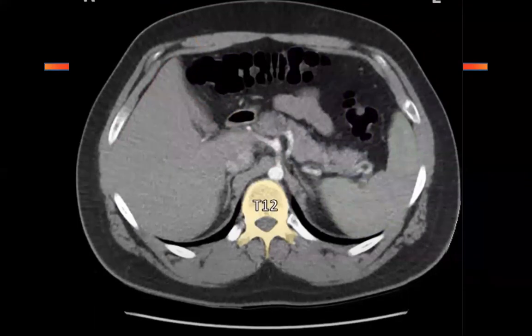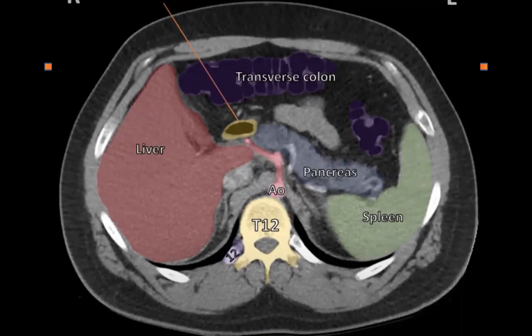Everybody with me? So far, so good? Yes, sir. We're going to take time on this, okay? I really don't mind taking time on this. The other thing I want you to also see is the pleural space. Can you see the recess? Yes, sir. Okay, good.